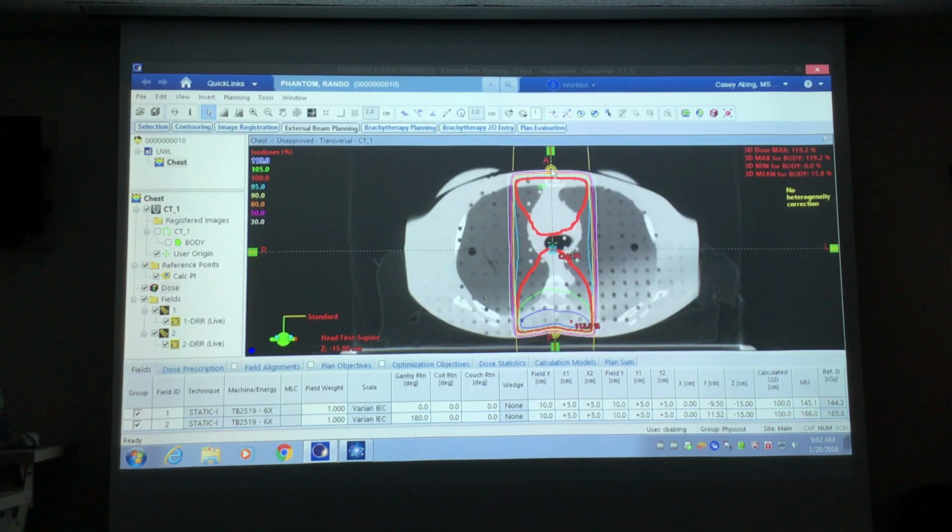So if I were to set this patient up on our treatment machine at the AP SSD of 100, and then I were to rotate the gantry around to 180 to treat the PA, I have to raise the table up, in this case 21 centimeters, to set the proper posterior SSD of 100.